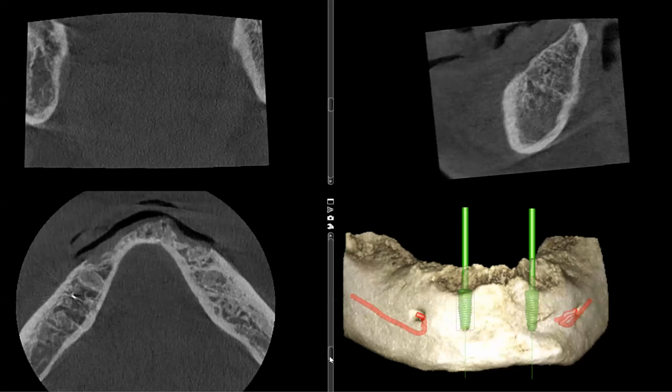So right here, as I looked at the scan just through the edentulous mandible, I really didn't see much, as in nothing that really concerned me. All these extraction sites have been healed or are healing normally, so that really didn't concern me, and that's probably retained dental material, most likely, depending on where it is, right?